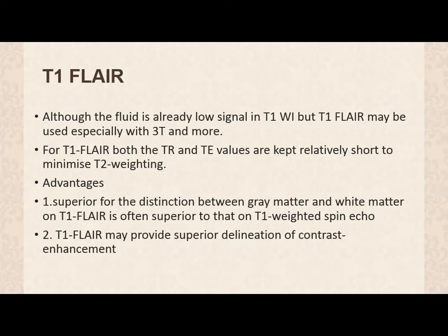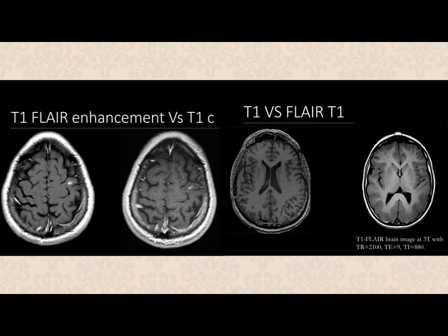The contrast enhancement on T1 will be even better than on T1 conventional image if you use T1 FLAIR. We don't use it here a lot, by the way. So you can see here the T1 FLAIR versus T1 contrast. You can see the enhancement is better, perfectly demonstrated.